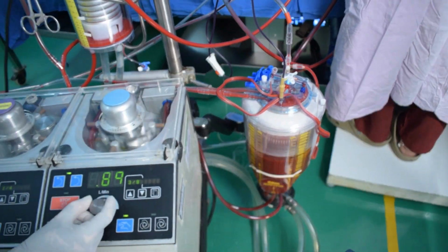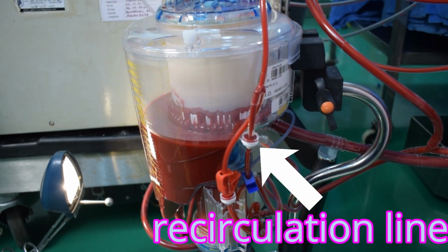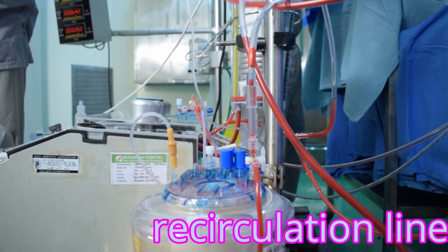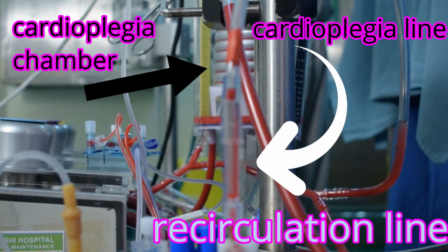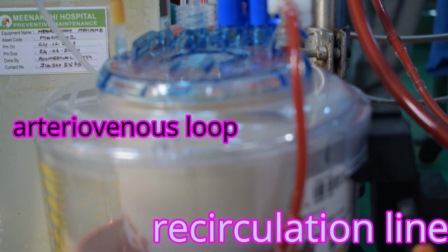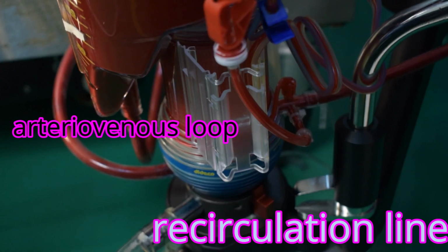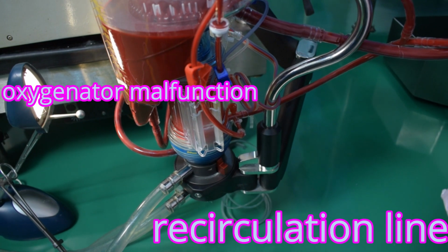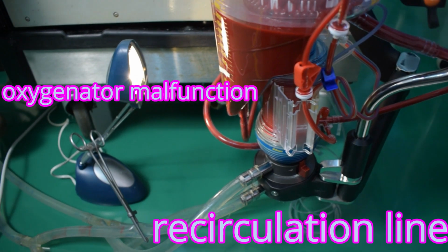The membrane oxygenator circuit is designed to include a recirculation line from the arterial outlet of the oxygenator to the venous reservoir. Now, as discussed in my previous video, this line is important to de-air the circuit. It is the line that provides oxygenated blood to the cardioplegia circuit. It is the line that allows continuous reperfusion through the arterial and venous reservoir in patients who are under total circulatory arrest. It is a circuit which can eliminate air that has accidentally entered into the cardiopulmonary bypass circuit, and it is set to assist in case of an oxygenator malfunction.